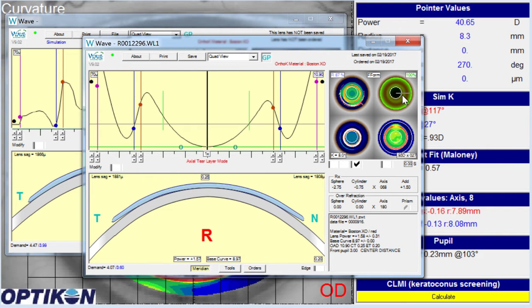If you look at the simulated tear graph, it's going to look pretty wild with a crazy amount of clearance out here. But this is based off a topography that's not really true to life, so this is going to look quite odd. This case will probably depend a little bit more on how the fluorescein looks, because we're not going to be able to rely on the simulated data here.